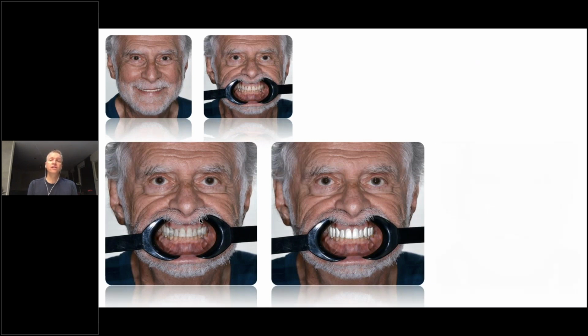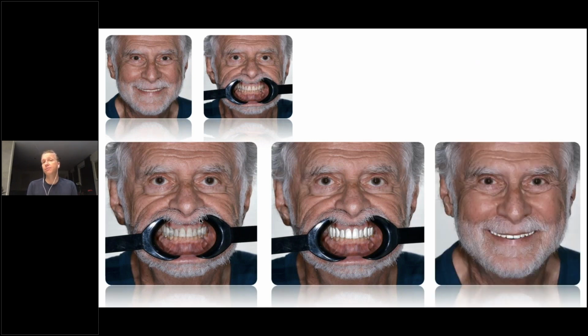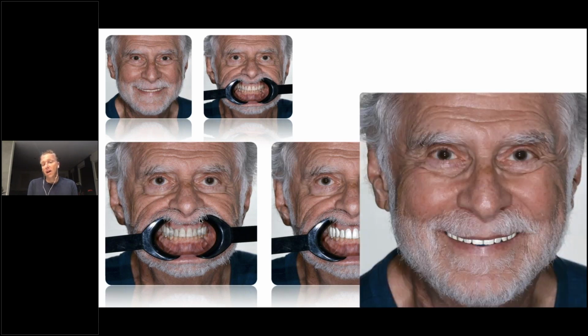As long as the function is still given, I can go with that. And I can see the patient smiling here. And that's what he basically liked to have. Yeah, so now I have to admit it's a nice, good smile. I think the premolars or even canines are a little bit long on that smile, so I have to still bring them up a little bit. But that was the first draft.